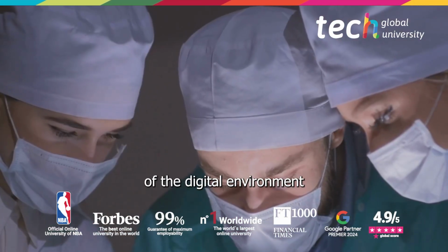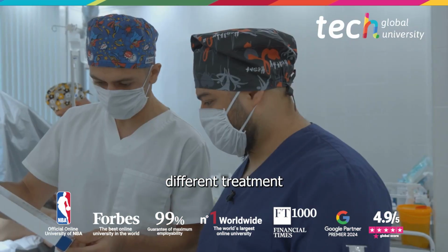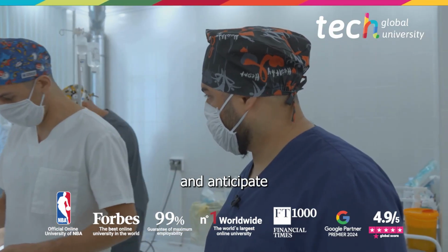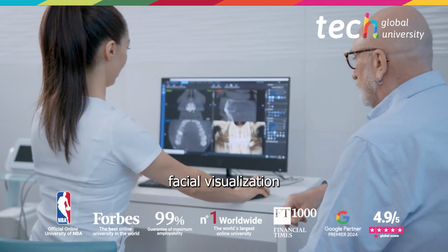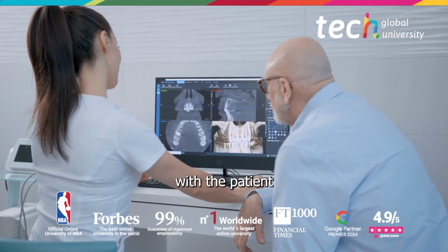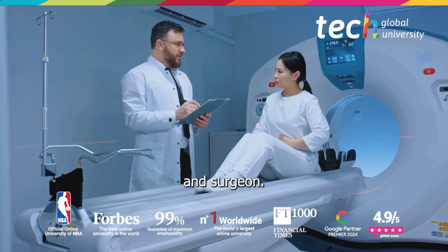Among the advantages of the digital environment are the ability to evaluate different treatment alternatives, optimize the airway, and anticipate residual asymmetries. Additionally, facial visualization facilitates communication with the patient and collaborative work between the orthodontist and surgeon.